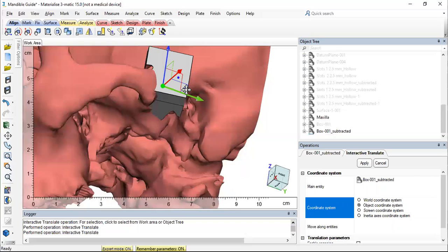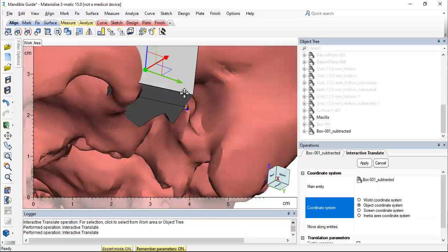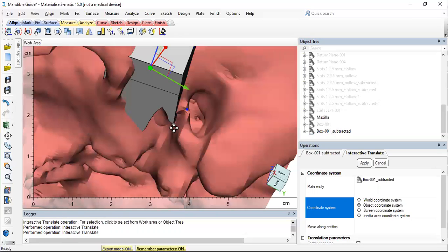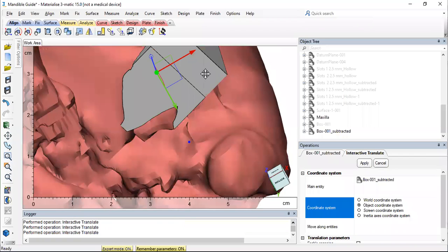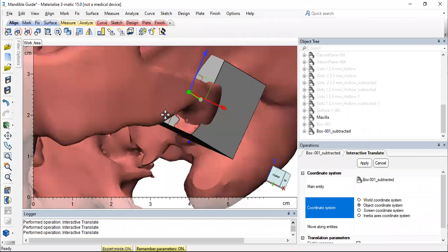ये ऐसे पोजीशन पे आना चाहिए था, तभी वो लोब के साथ ओवरलैप हो रहा था, राइट? आपको उसको नीचे भी मूव सरफेस करना पड़ेगा. इफ यू सी राइट नाउ इट्स नॉट द एक्यूरेट, सो दिस हैज टू कम समवेयर डाउन आल्सो थोड़ा. बेसिकली ये केस टू केस, पेशेंट टू पेशेंट चेंज होगा आपका क्या डायमेंशन. आपके डायमेंशंस कभी कांस्टेंट नहीं रहेंगे बेसिकली फॉर अ पीएसआई. So accordingly, what you can do is you can Boolean subtract, then create your surfaces, and then merge the components.